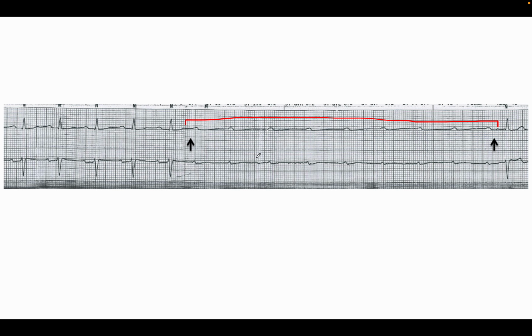So this massive pause we call ventricular standstill, and it's a consequence of a lower hierarchy pacemaker not taking over. So we don't have an idioventricular escape rhythm, we don't have a junctional escape rhythm supporting the patient's own heartbeat basically, and this would cause someone to collapse. And if someone was to have a complete heart block, this might be the reason why they could be in cardiac arrest, because they've got no underlying intrinsic rhythm.